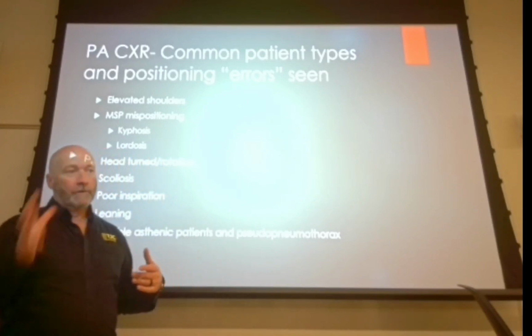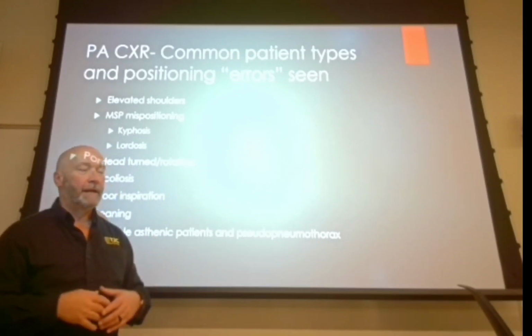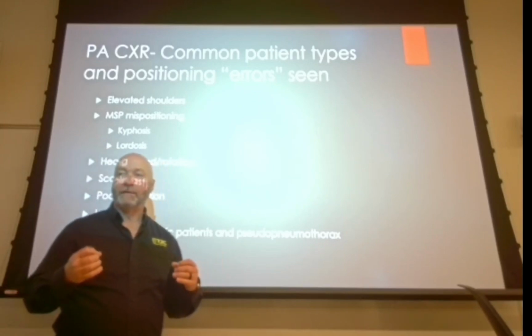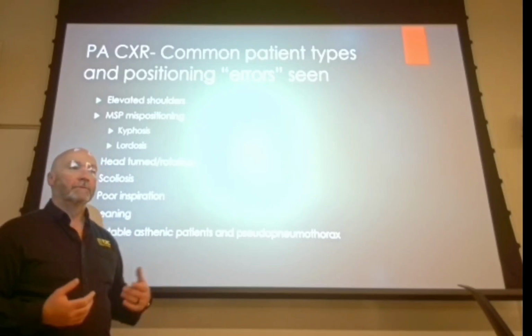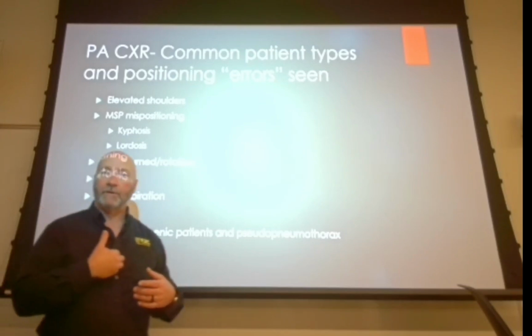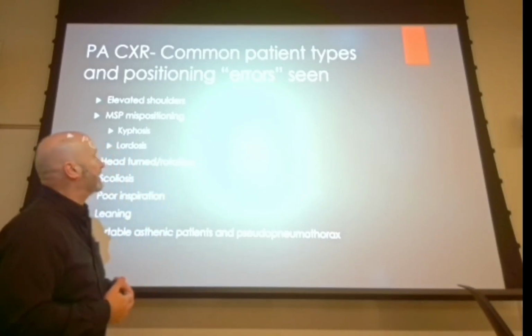But if a patient has a little bit of a bow in their back, especially your older patients who are prone to compression fractures in the spine, just look for that. On your portable chest x-rays, your AP chest x-rays, still try to angle perpendicular to the sternum. Again, I'll get to that here in a second.